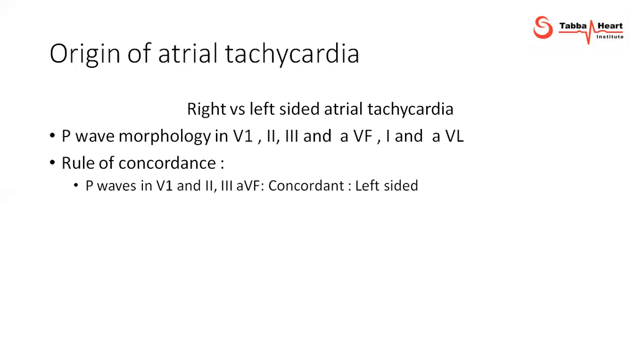Concordance means the morphology of the P wave in all these leads is similar, going in the same direction. It can be all positive or all negative, right? So if the P wave is positive in the inferior leads and V1, this is usually a left-sided tachycardia.